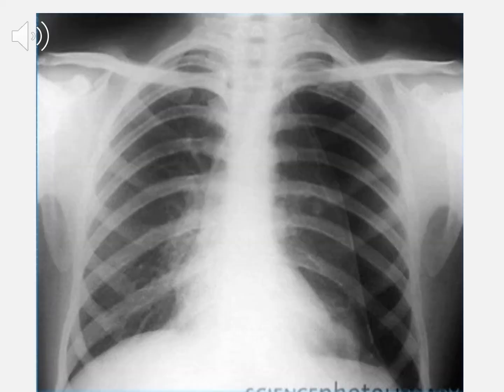So pneumothorax, again, when evaluating a chest x-ray, you want to look at the lung fields and make sure they have lung markings, right? And so you can tell that by looking at this image in the left lung, which is on the right side of the screen. The left lung, you can see the definitive line, the border, where if you look at the lung space, you see lung tissue, you see lung markings, the definitive line, and then you have blank air space, which is air. So you can see this probably about a 50% pneumothorax on the left side.